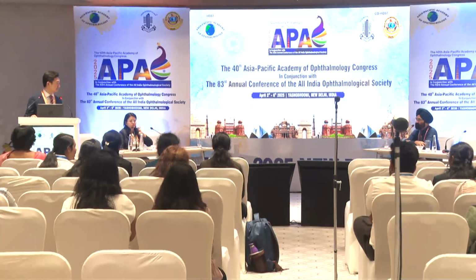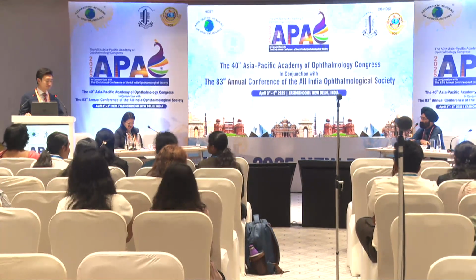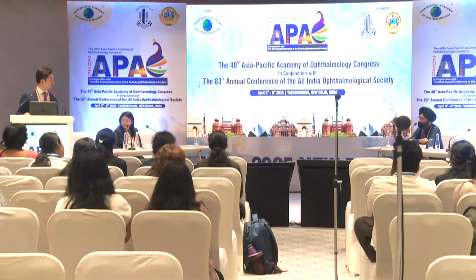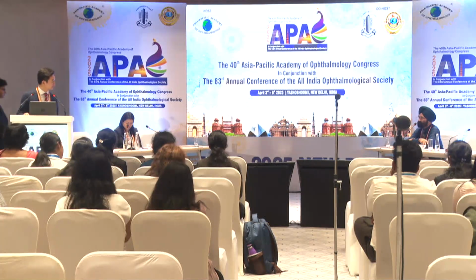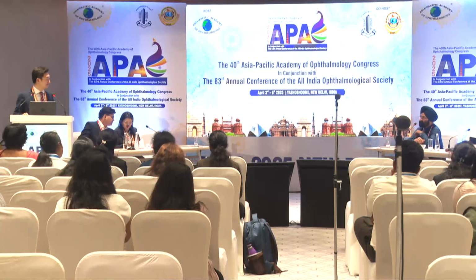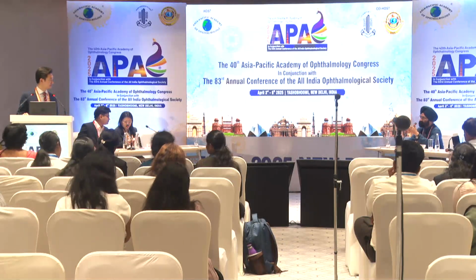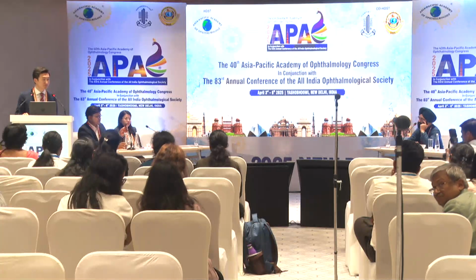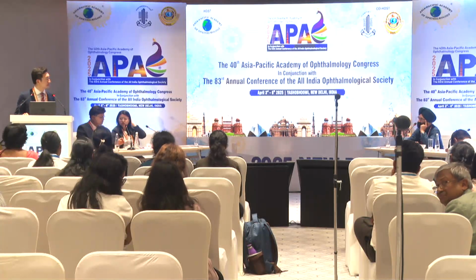That's a very nice presentation of objective assessment and to see the progression of PACS in the clinical course. So you think the most important parameter which I could understand from your studies is AOD 500. Depending on AOD 500, you plan the further treatment strategies, whether to do LPI and/or to do clear lens extraction. Is that so?